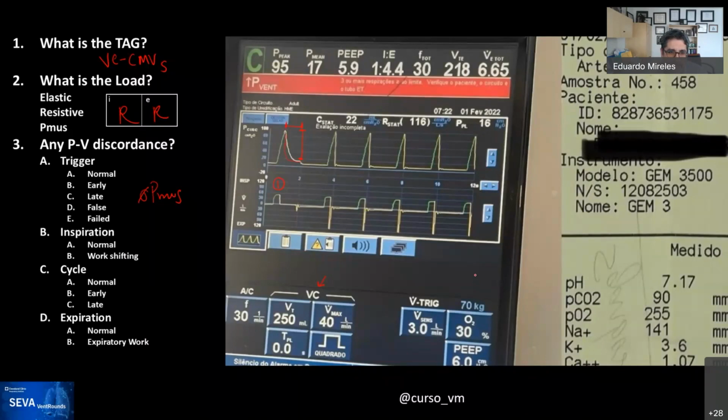Yeah, so my thinking in this particular case was that the reason for that is that at the instant where the inspiratory pause is applied, in other words, where the flow goes down to 0 and the inspiratory valve closes, at that very instant, the airway pressure is 95. It's obviously not typical. So at that instant, the airway pressure is 95, and the situation is such that 95 is in the proximal airways and the circuit, proximal to the, I'm guessing, the source of resistance, which we haven't disclosed at this point.